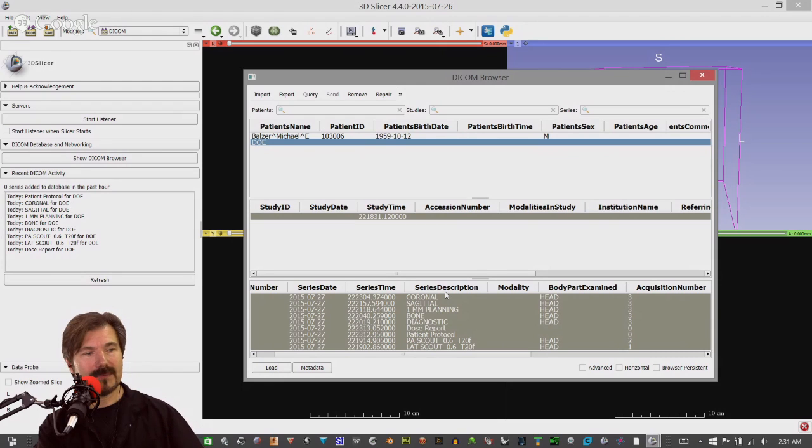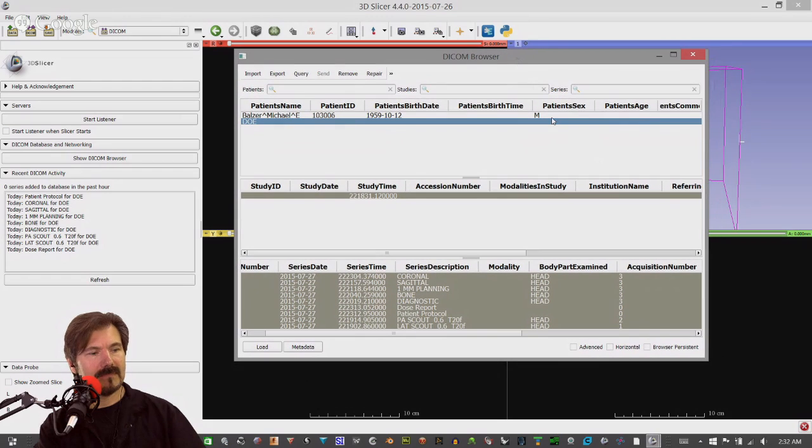One thing I was going to say was this is actually a good example. This scan that you're working with, the 1 millimeter wasn't uploaded originally into PACS, which is pretty much the operating system that most DICOM viewers that most radiologists use. And I went to the techs after they did the scan and I asked them just for the hard data for the 1 millimeter. And even though it wasn't in the initial PACS file that they gave us, they still usually have it. So just as a tip to any radiologist thinking of getting started on this, just because the 1 millimeter isn't on the PACS that you just took doesn't mean it wasn't taken. So always talk to the techs and see if they still did send it through, and you can maybe get them to pull it up for you, like what I did here.